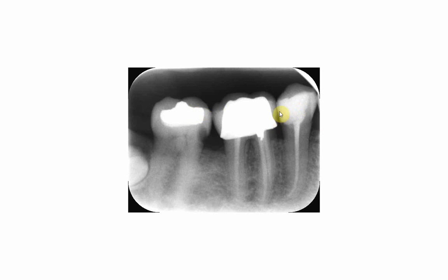And this is the porcelain, which is fused to the metal and forms the final layer of the crown. You can see that porcelain has lesser radio opacity than composite, lesser than amalgam, and lesser than the metal core of the crown.